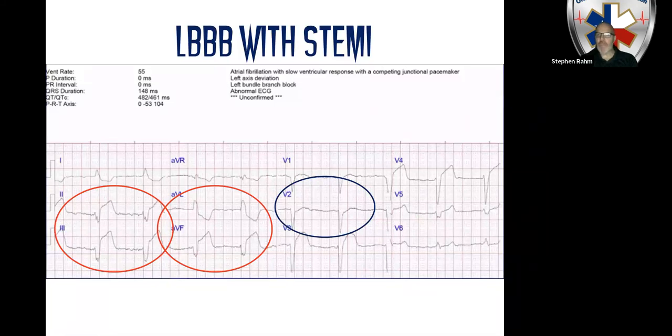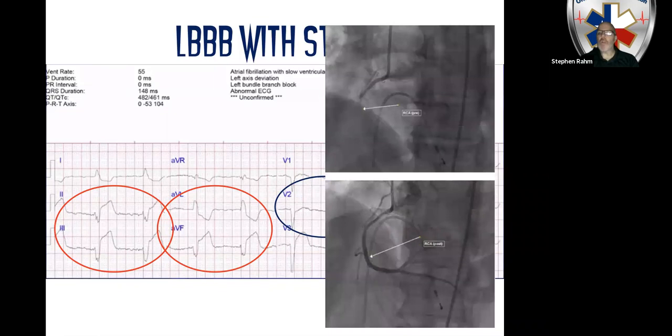Remember, you only need to see that in one lead, right? But we see it in multiple leads. You see it down here in 3, a big time ST elevation. Same thing in lead AVF. And if you look at lead AVL, this R wave in AVL is only about 6 to 7 millimeters tall, but your J point is way down here, and you have almost 4.5, maybe 5 millimeters of ST depression. So this would mean that those leads are showing excessive discordance following the Smith modification, or his definition of excessive discordance. And this patient ended up with a right coronary occlusion.